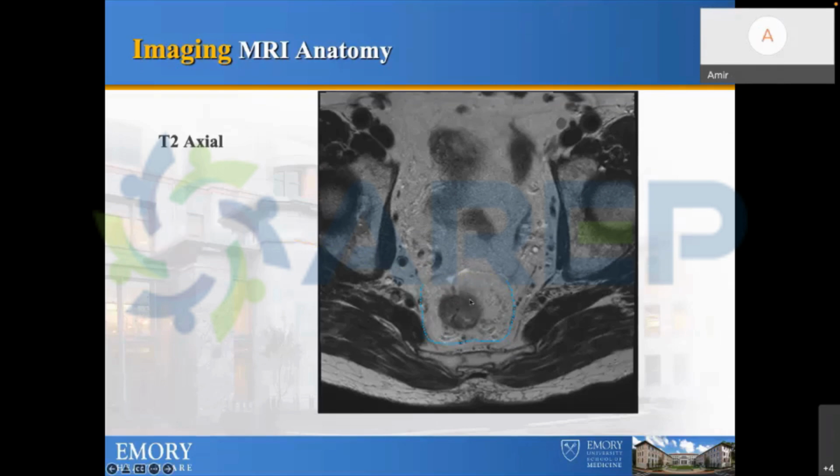Okay, perfect. So again, this is at the level that we are higher. This is a high rectal level. We see the mesorectal fascia posteriorly, and anteriorly we see this peritoneal reflection. So remember, when we say there's a tumor sitting here or the tumor sitting here, if the tumor goes into the peritoneal reflection, that would be a T4 stage tumor. But if the tumor is just sitting here, it would be T3 stage if it involves the mesorectal fascia.